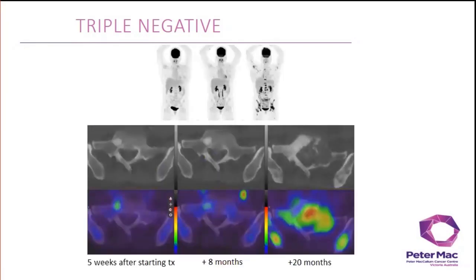At 8 months, there was certainly no evidence of progression on FDG. The sclerotic finding on CT remained stable, although we acknowledge that once a lesion is sclerotic on CT, we lose the ability to provide response assessment within that lesion. The activity on PET remains low grade and indeed slightly less than the prior study. So again, did this prove we were right?